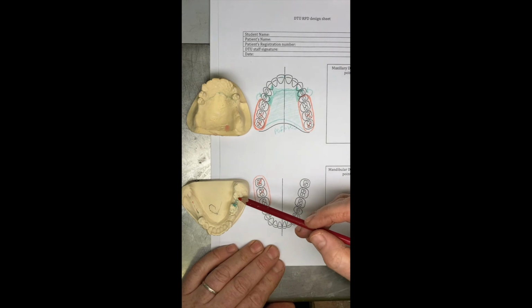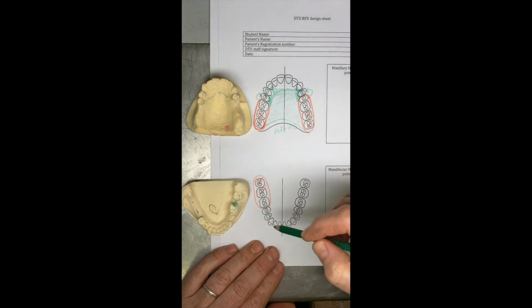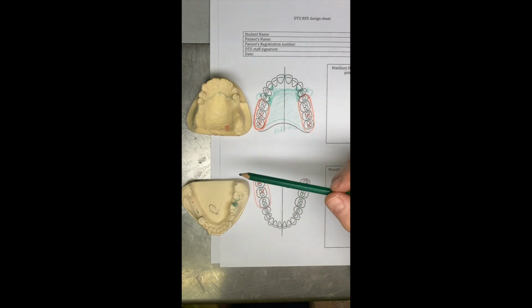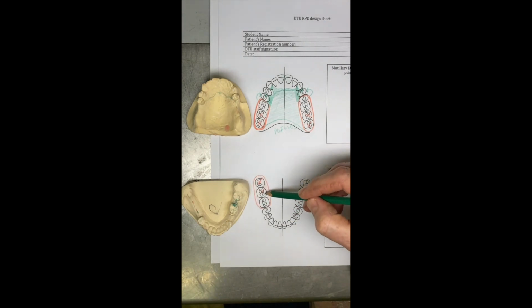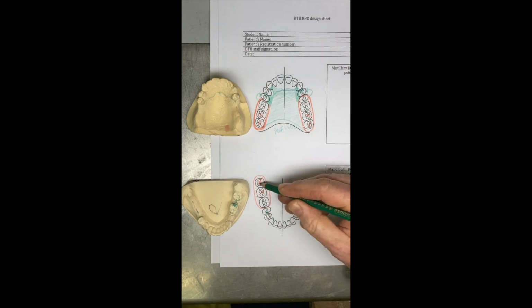It's this missing 7, the 8's drifted forward. We've got the 6 standing. It's given us a convenient space to bring some metalwork round onto this tooth when we get to that stage. So when we're looking at support then, same rule, occlusal rest on the opposite side of the abutment tooth because it's a free end saddle.